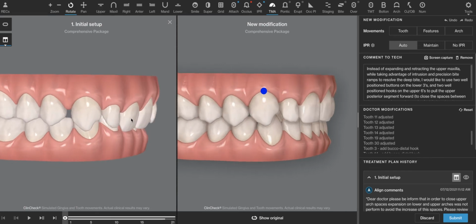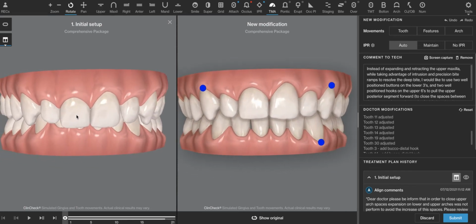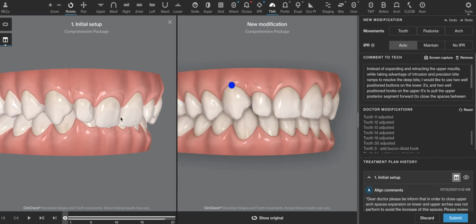This reminds me of our patient Bruce that you just finished the aesthetics on. Bruce had parafunction on top of having this relationship. Why is that important? Well, parafunction means the muscles are being overworked, or they're often applying a lot of force to the teeth. As a result, the bone around the teeth tends to be a lot more dense, and as a result, the teeth are harder to move.